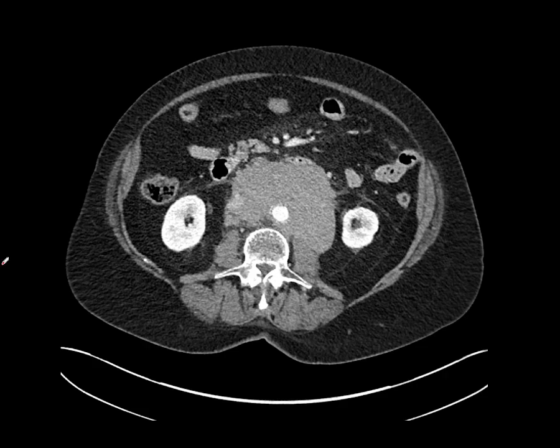If you can see a cyst completely, even if it's large, and you can't demonstrate any malignant features in it, you think it's benign, then that should count as a satisfactory evaluation. The important thing is that you interrogate the whole of a cyst before you make a conclusion. If you can't evaluate it completely, then you're really not in a position to be sure what its internal nature is. And that's just illustrated here.